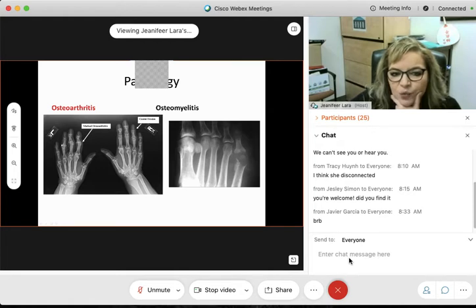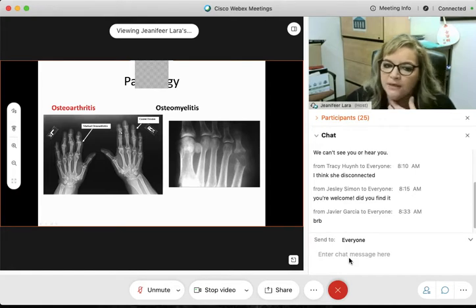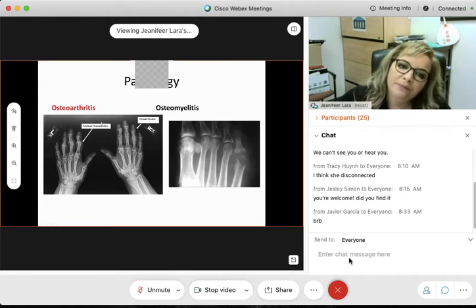We can see swelling. So you start to lose those sharp outlines, and here it's sharp, but here it's not. You see that there is some type of growth. So get a good look, go back.